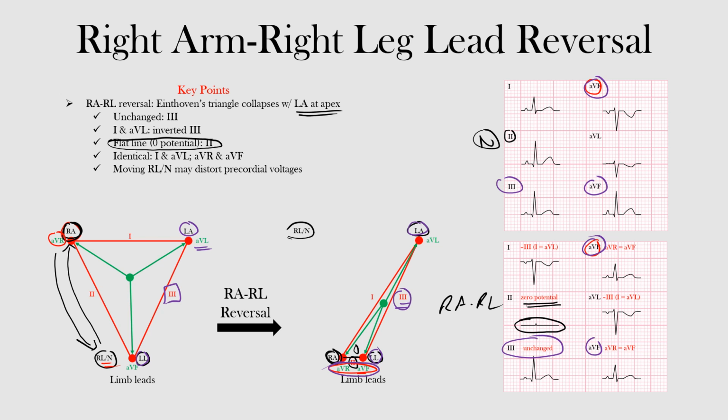So why is that the case? Well, it's because lead 3 normally goes in this direction, okay? And notice that AVL is going in this direction towards it. And now again, lead 3 still going in the same direction. And notice AVL still up here, and it will pretty much be going in the opposite direction. So we can see that AVL pretty much becomes an inverted lead 3.